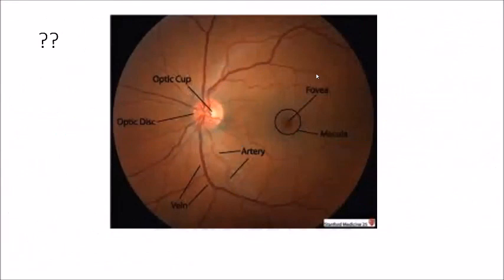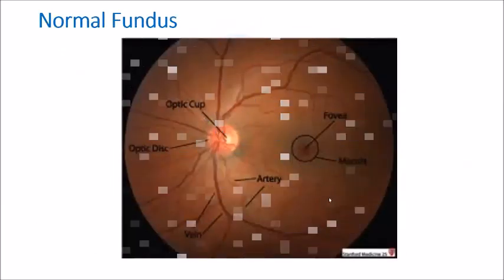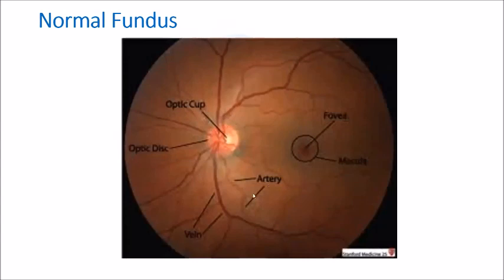Now the question to you, as it is an interactive session: is it normal or abnormal? Please, anyone, you can unmute yourself and tell. Dr. Faryal, Mahbub, or other colleagues, is it normal or abnormal in your observation? Dr. Faryal? Sir, it looks normal. Other persons are silent, they are waiting for us. Yes, thank you. This is normal.